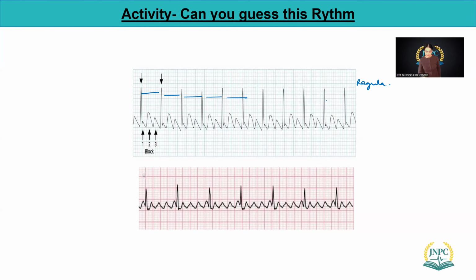Not really, right? So we have QRS, and then I don't know if it is T or P, what is it? Instead of a P wave, we have some sawtooth, the seesaw we use for wood chopping, right? So if you see sawtooth, it gives that sawtooth shape.